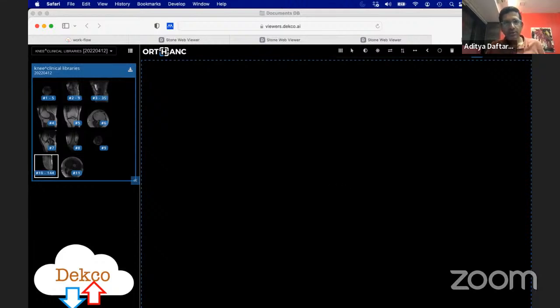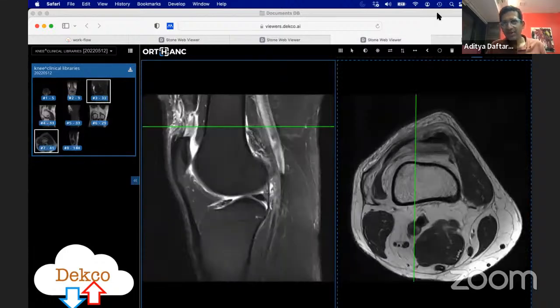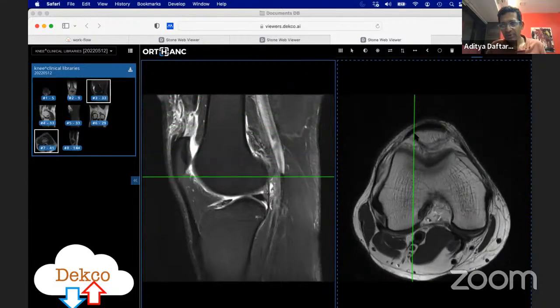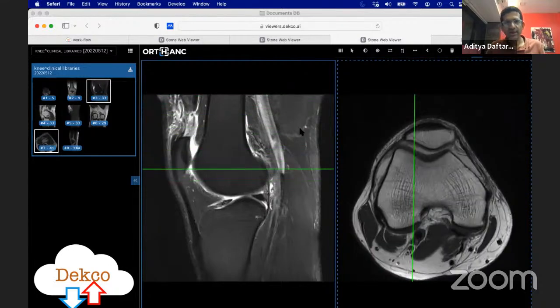Okay, so if we're looking at measuring trochlear depth, there are a lot of questions people ask about how to measure these things. I'm really not even sure how often people use these measurements, but if you had to measure the trochlear depth, typically what you want to do is, I'm going to show you some cartilage cases in a minute, don't worry.